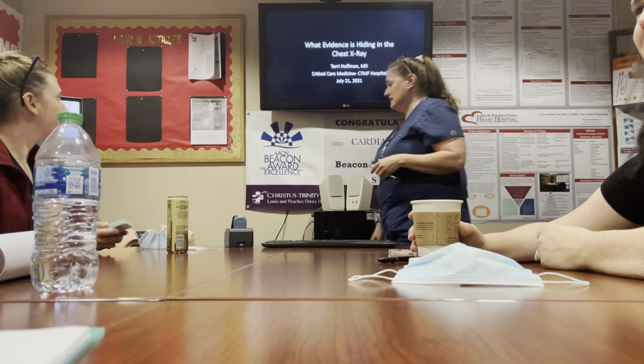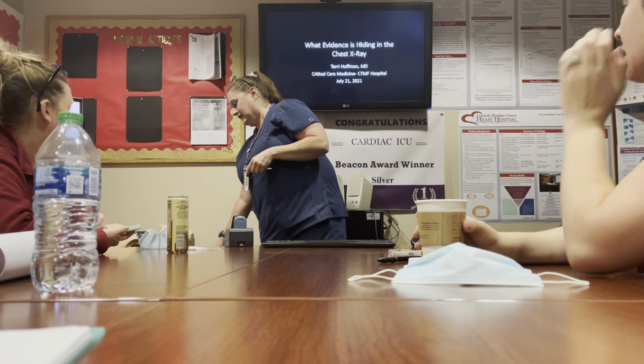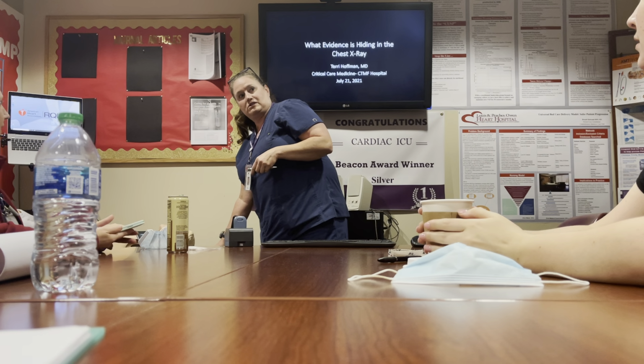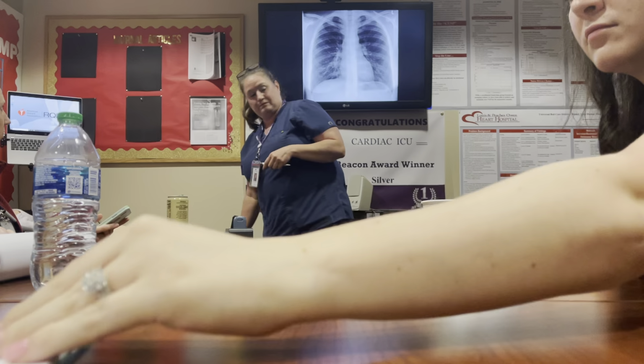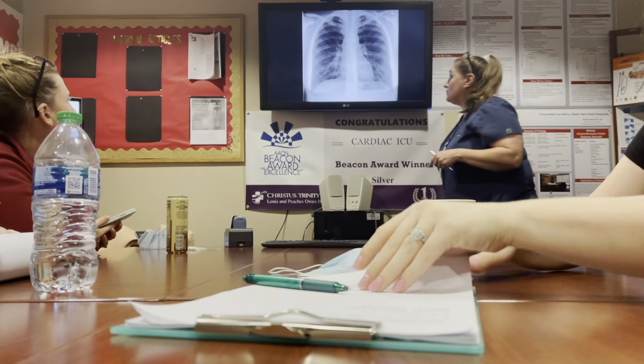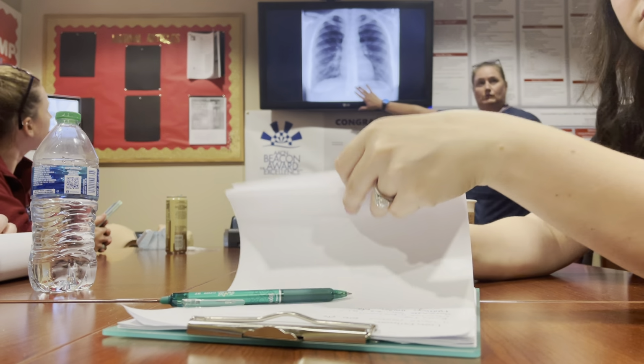I promise. Okay. All right, so I was asked to give my chest x-ray lecture, and I've kind of revised it because this was originally a trauma chest x-ray lecture. So this is a normal x-ray. Trust me, it's normal, okay?